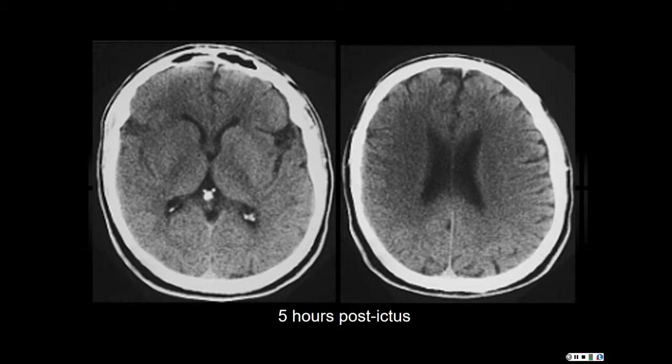If you have ischemia in the right middle cerebral artery territory elsewhere, but you have spared the basal ganglia, and these are intact, thrombus is going to be right there. That's an important point. And the thalamus is spared because it's coming off the posterior cerebral artery. Thalamoperforators, PCA, tip of the basilar.